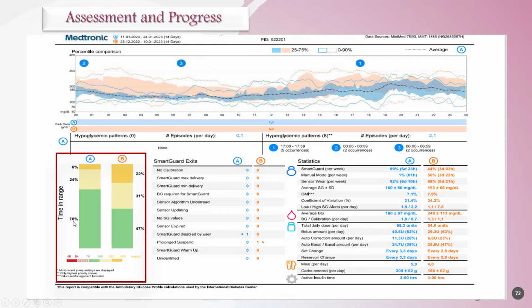And as pediatricians, as we knew before, our eyes go to the hypo first. So if you read for me this time range, you tell me there is no hypo before telling me about time in range, I will be happy. I will see that you are oriented in pediatrics, because we are concerned about hypo before hyper. Okay, so most likely he was improving during this time segment.